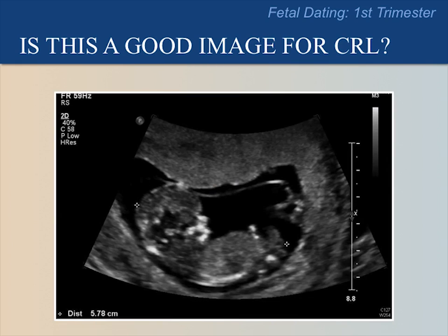Is this fetus in an ideal position for measurement of the crown rump length? This fetus is also slightly flexed or bent, but is overall in an acceptable position. The fetus is in profile because we can see the face. The calipers here are correctly positioned from the top of the head to the rump.